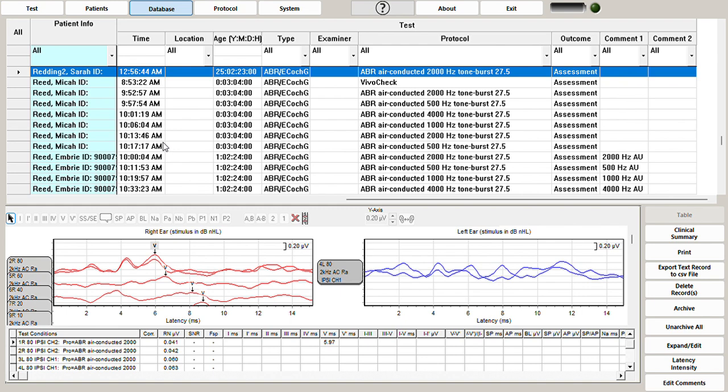I'm going to go back over to this right one here, and I'm going to click on this bubble. This is the one I started labeling. I had labeled my 5 already while it was running, but I'm going to come back in and we're going to label a 3 and a 1 also. You'll see at the bottom down here this is going to show the latencies of each of them.